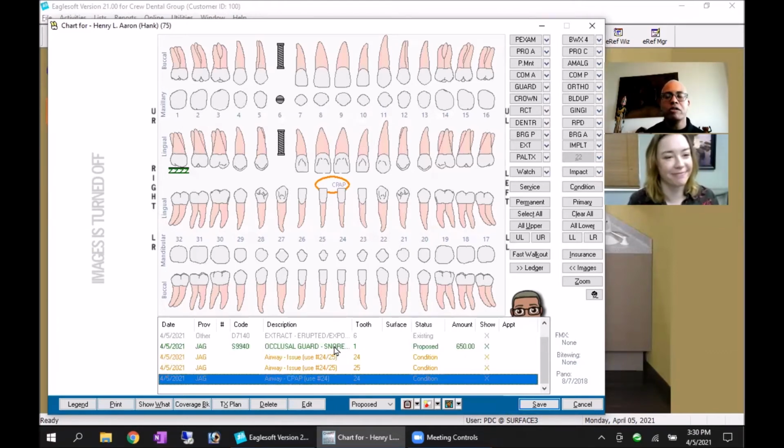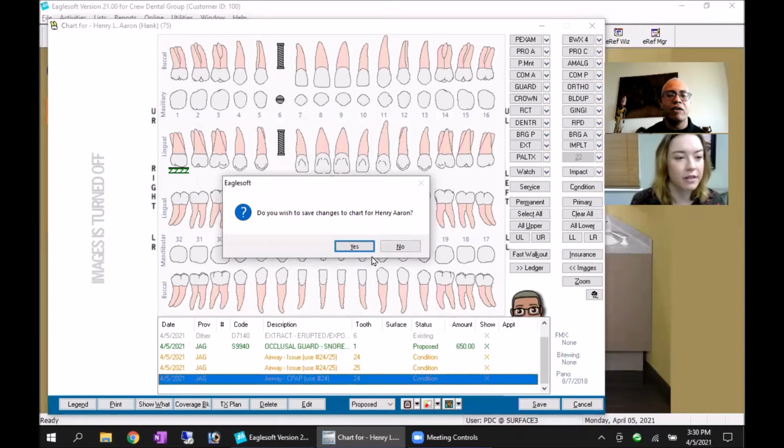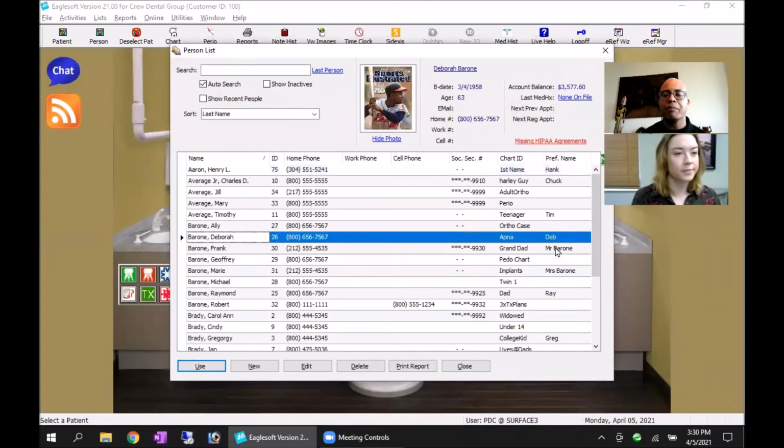The more that you do, the more that you can see, the easier it is. And just so everybody knows, if you just want to make this easier, grab my airway issue patient here. So I've got an apnea patient.